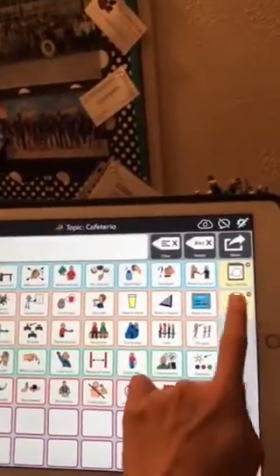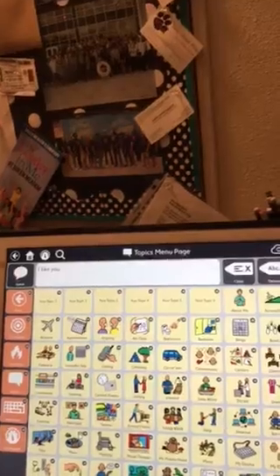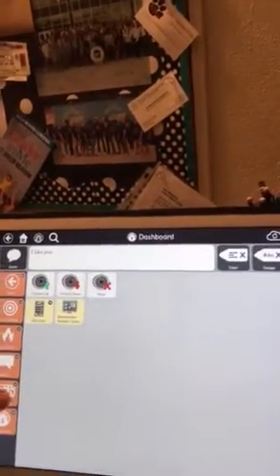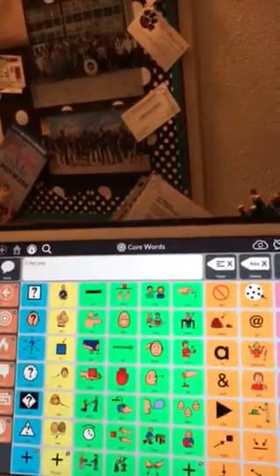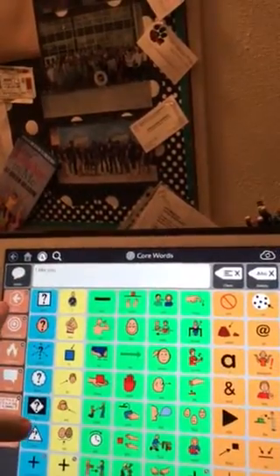Troubleshooting is pretty easy. There is this life jacket here that's visible, and it says supports. So you can ask for help there. Within the app, they send you an email from the manufacturer when you download it and create your account, where you can get help from. But otherwise, when all else fails, you're pretty much always good going with the back button, and you'll get back exactly where you want to be.